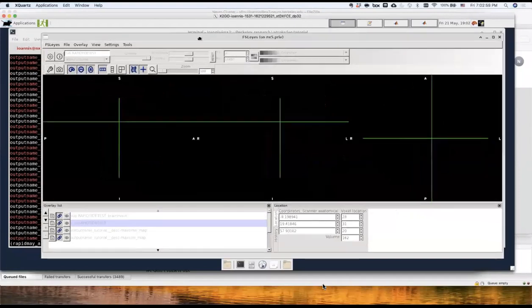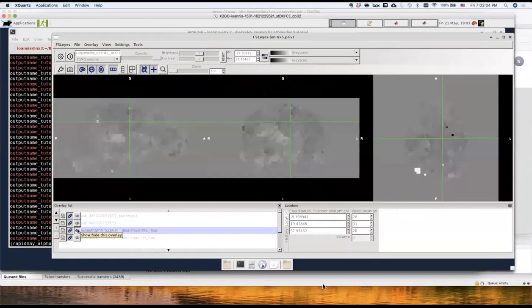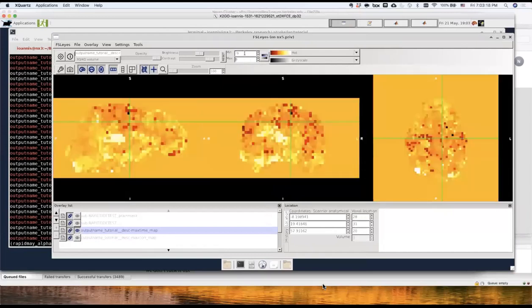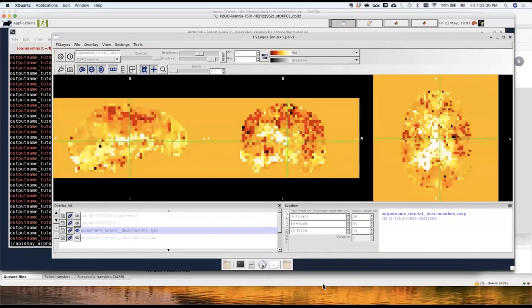Is the file that's been named output max time map, and this is basically the actual lag time map. I can put some coloring here, and I can use a more confined range. This is a 3D NIfTI file where one can see the lag times.